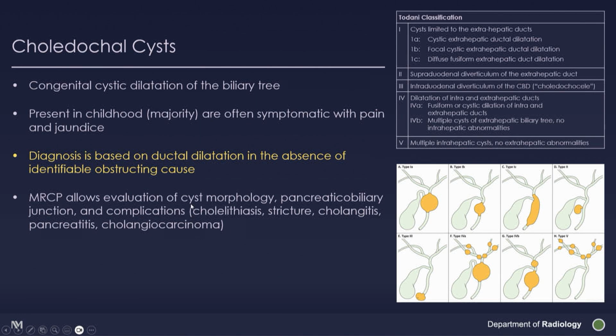And MRCP can be helpful because it can show the cyst morphology, it can show the pancreatic biliary junction, which we'll talk about, as well as the complications associated with it.